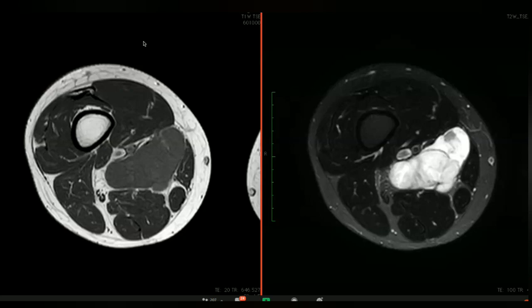You're going to have to do an ultrasound guided biopsy on this. Yes, ultrasound guided. Unfortunately, the concept of sarcoma management in Pakistan is non-existent. It's a dilemma that I unfortunately feel angry and upset about. But if you see a lesion like this, what this patient needs is a competent radiologist, a competent surgeon, an ultrasound guided biopsy, and a competent histopathologist. And then based on the results of the ultrasound guided biopsy, a competent surgeon should decide to take it out in the most appropriate manner.